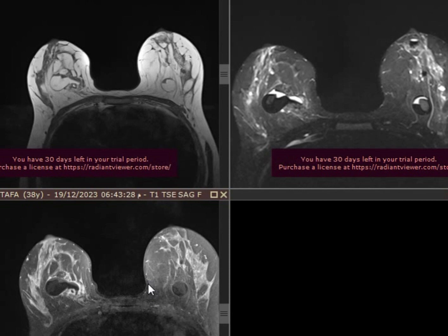If you focus carefully, what does it look like in the pelvis? A dermoid, right? Do we have a dermoid in the breast? No. I looked it up, I didn't see it. It looks like a dermoid, but there's no dermoid. I've never heard of a dermoid in the breast, and I looked online for any reported cases. I didn't find any. Dermoids are mostly midline.